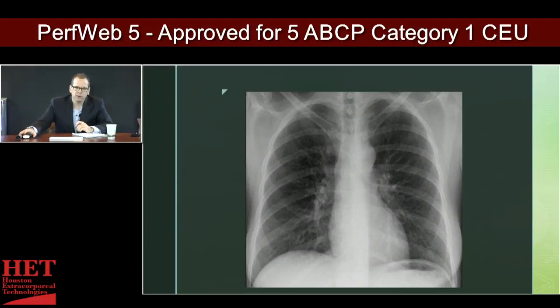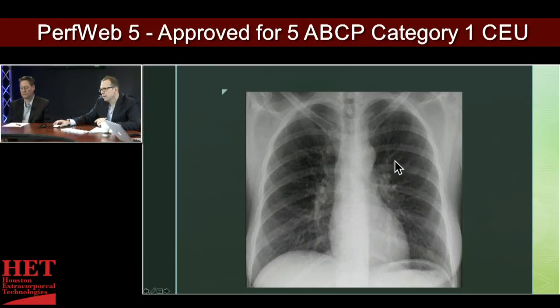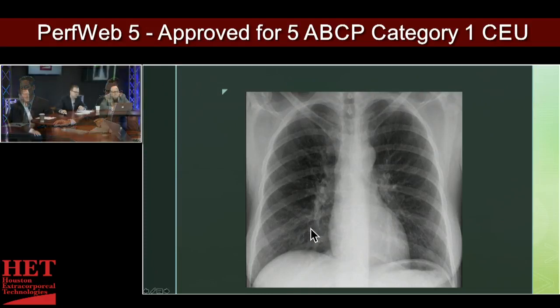What you see that's different with vascular congestion versus the ARDS is these lines, this cephalization of vessels, where you see little white hazy streaks that emanate from the hilum and go down. Down here in the lower lobes, it's a little more apparent. You see this patchy stuff, but if you close your eyes and imagine, it forms little lines, and that's just the edema in the vasculature. So this would be vascular congestion, fluid overload, CHF exacerbation.